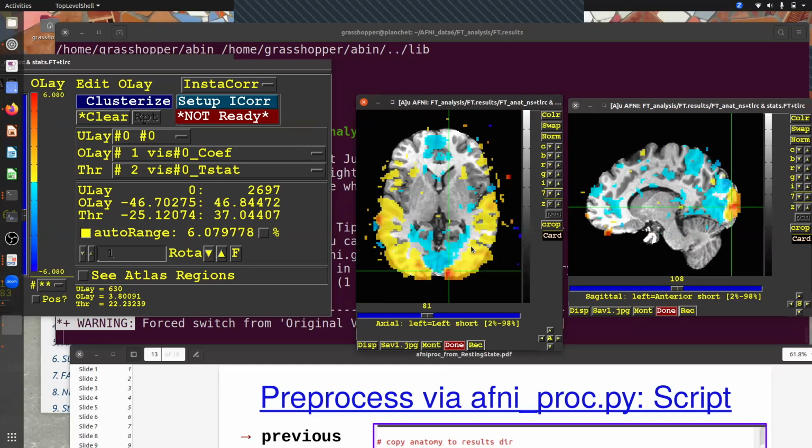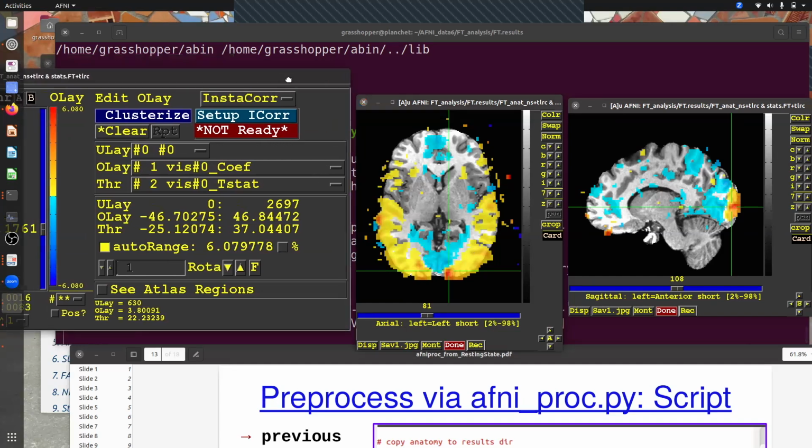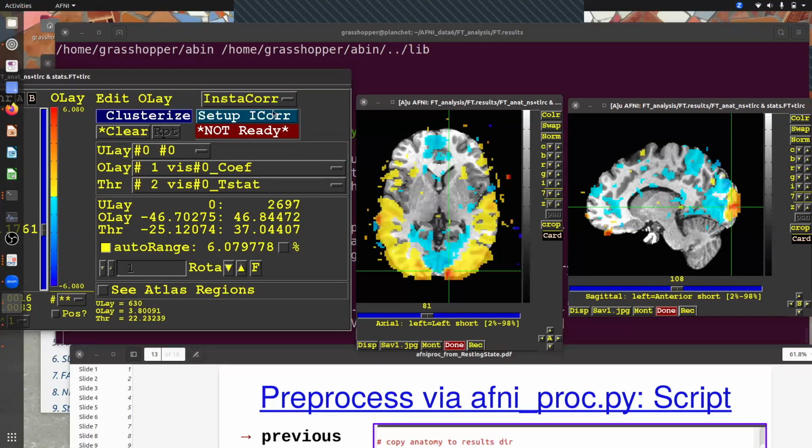So now what do we notice about where things are? All of that stuff that had big ±6 that looked like big effect estimates outside the brain, that also had giant error bars, essentially. The statistics there were very small. Conversely, you could say that the uncertainty there, the standard error, was very, very big. So the reliability of those numbers is very poor. So we kind of combine these pieces of information where our effect estimates are large, where our uncertainty is high, where the reliability is low, let's say.